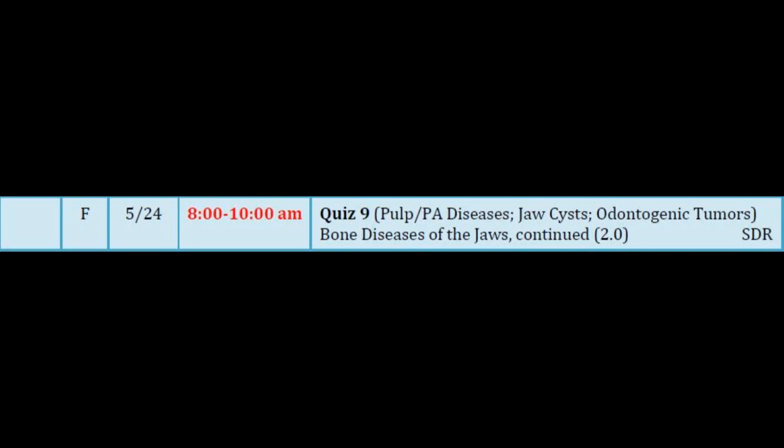Do you see an ill-defined radiolucency affecting several teeth? History of tooth mobility? Hopefully you'd at least be suspicious of malignancy, and if it's an older adult, metastatic carcinoma should be top of your list. Do you notice how it's causing some internal resorption? It's actually invading the pulps of the teeth and resorbing from the inside. Cancers can do that. Kind of cool. That one came from the eyelid. Adnexal structures, the eyelash, forming something or other. I don't expect you to know where it came from, but that's what they found out.